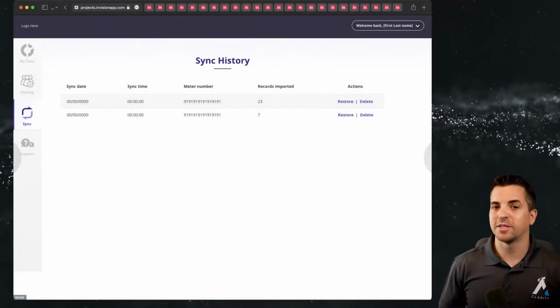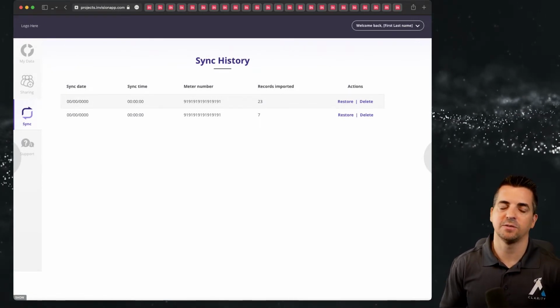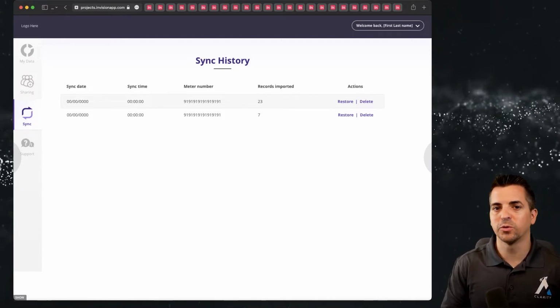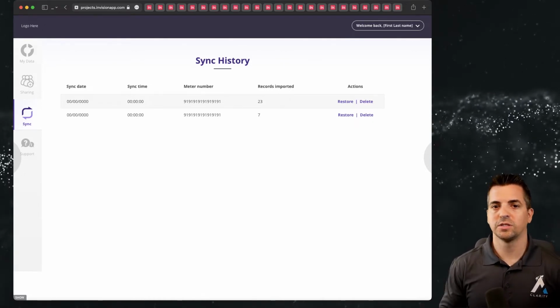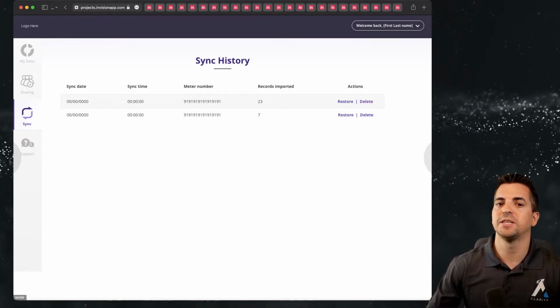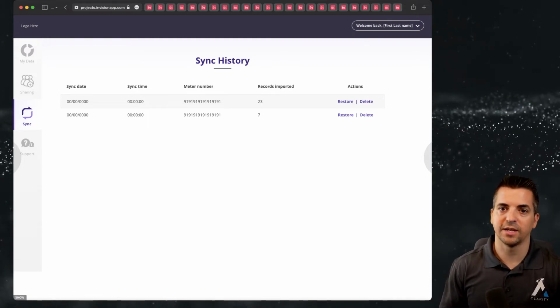Okay, so the very first thing we want to cover is a concept that we refer to as a data sync within a glucose reader application. This particular application has a web portal that is used for the actual patient, for the doctor or the healthcare provider, as well as supporters. And the patient can update their data using their mobile device. So we'll show some of the screenshots of that in just a moment.